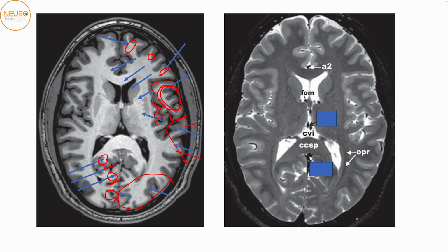At this level, basically the level of the atrium, the cingulate forms a structure known as the isthmus. The isthmus connects the cingulate gyrus to the parahippocampal gyrus. So this is the region of the cingulate isthmus. So you can help pick that up with the level of the atrium. So at the level of the atrium, you'll have two stems of the calcarine sulcus.